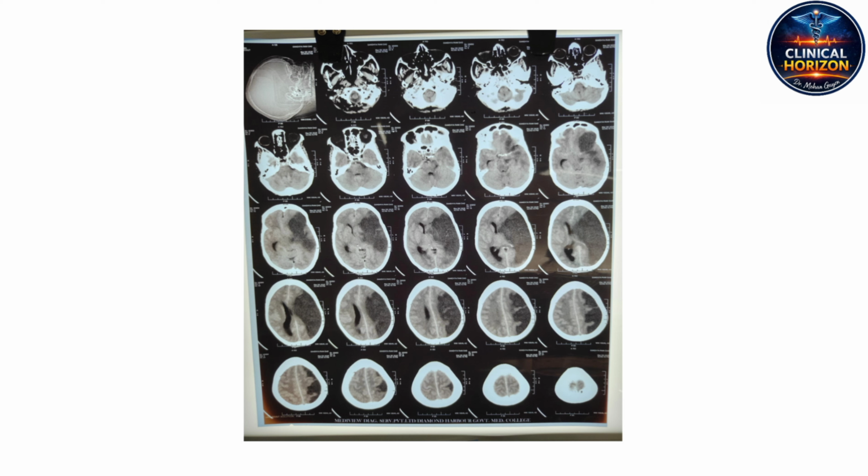And looking at the ventricles, the swollen tissue is acting just like the mass effect we saw with the hemorrhage scan. The cerebral edema is severely compressing the ipsilateral lateral ventricle and driving a dangerous midline shift. Which is a critical mechanical point to understand. A stroke isn't just an absence of blood flow. It's a physical mess. It is the creation of a swollen, space-occupying lesion. The necrotic tissue expands, driving intracranial pressure up just as lethally as a hematoma, often leading to fatal herniation syndromes if the edema isn't medically or surgically managed.